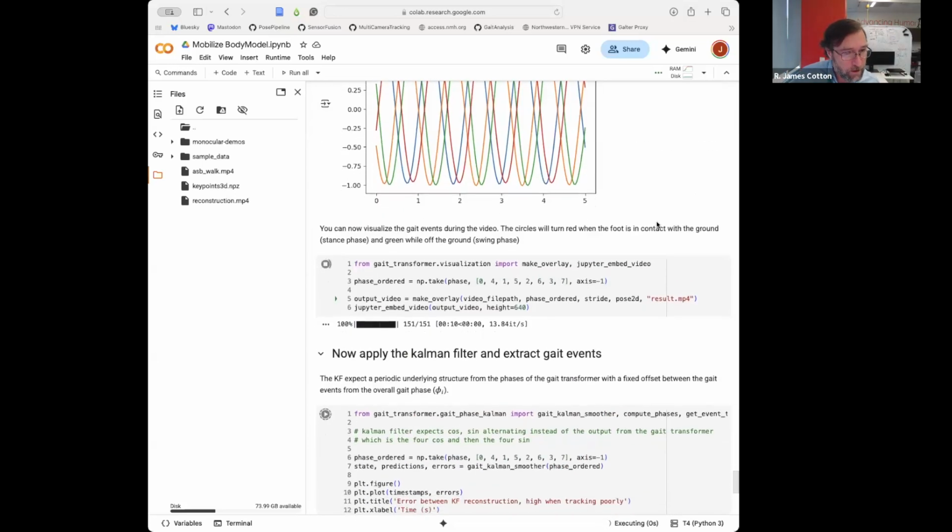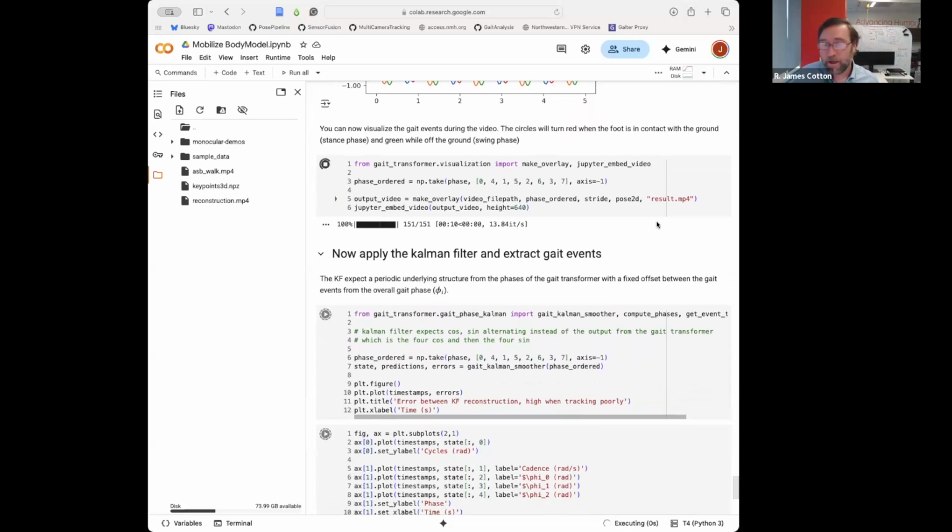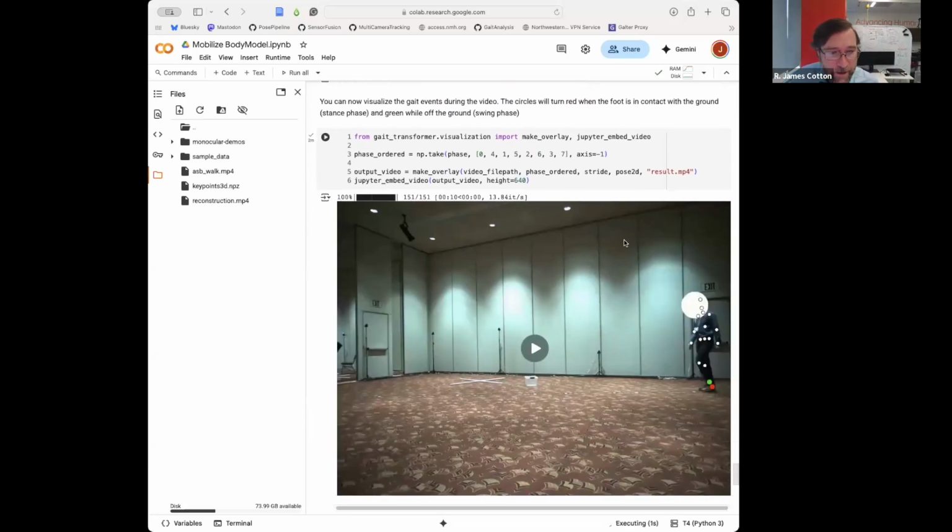Hopefully almost done with the overlay. And then, okay, there we go.